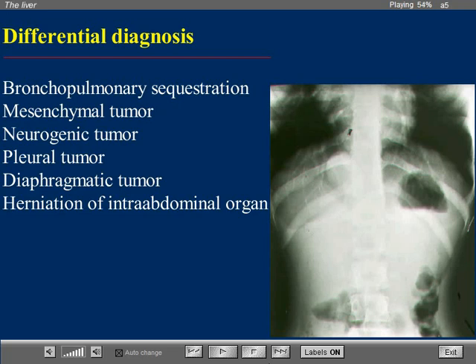It could be some bizarre herniation or partial herniation of the liver, perhaps through a defect in the dome of the diaphragm, post-traumatic perhaps. All these were possibilities, and they wanted to do surgery because of the inability of establishing the nature of this mass.